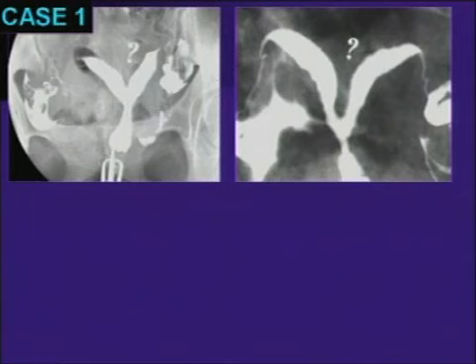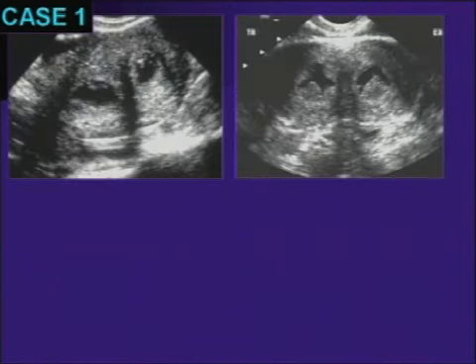It's a common problem. And it's very important to distinguish between the two because they have different risks of reproductive outcome as well as differences in management. So it's important to make that distinction. On axial ultrasound, the appearance of these two entities can look quite similar. This is actually a saline infusion ultrasound. And what's important in these cases is to get a good coronal view.